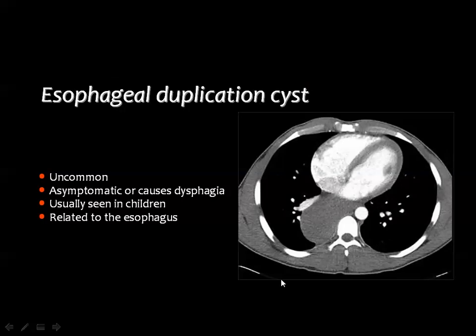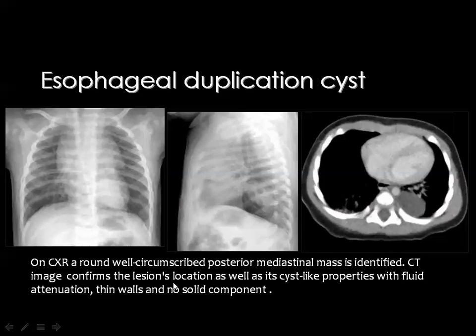And this is the classic example of an esophageal duplication cyst in almost a classic position. You see the cyst is located in the paravertebral gutter, and part of the cyst is insinuating itself between the heart and the descending aorta. This sign is diagnostic that this lesion is not of pulmonary origin. It arises in the mediastinum in this particular area. Then because of the tight space, it has grown to the right side.